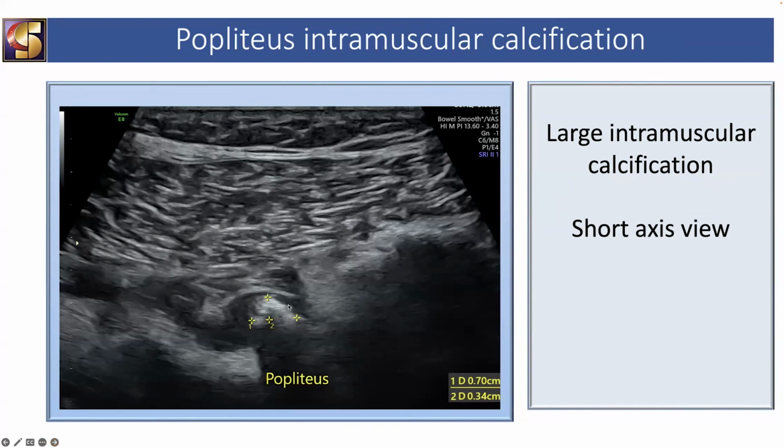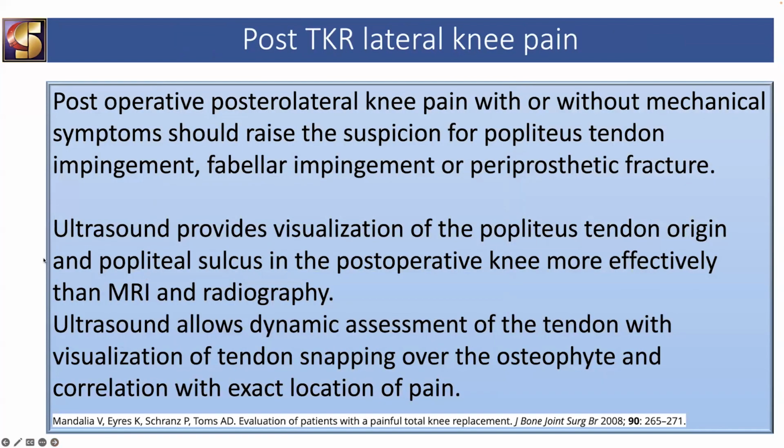And in short axis, we could see such hyperechoic foci within the belly of the muscle. So another common clinical reference is for the post-TKR lateral knee pain. And nowadays, it has been very common for this post-TKR knee pain.